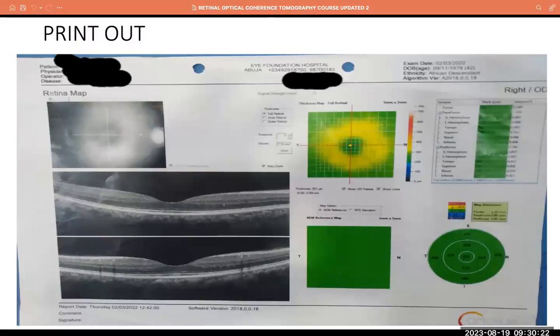So this bigger, wider map here now, if you look out, you see, okay, don't worry, when we get to the bigger pan, I'll use it to explain. So the green map that has something like a round yellow image on it, and then the pink lines, is the thickness map for the retina.